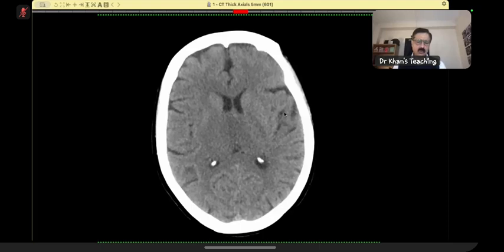The top four include bilateral deep venous sinus thrombosis, which I had shown you; artery of Percheron, which is a variant, because both thalami will go because of that acute infarction.